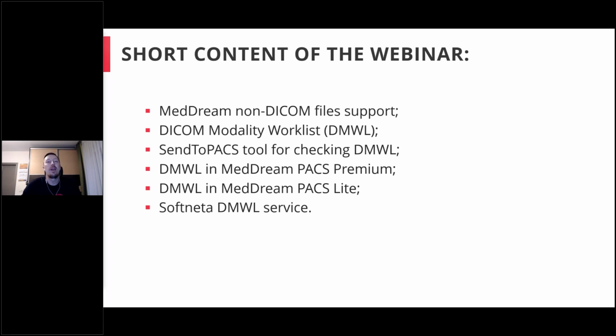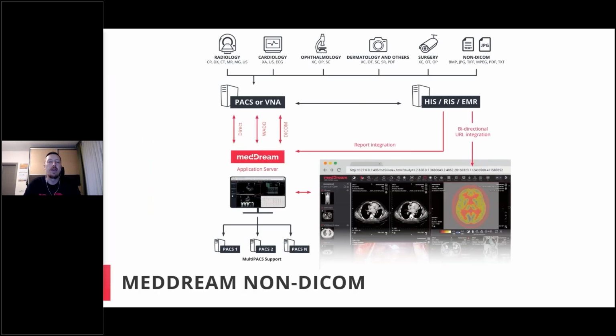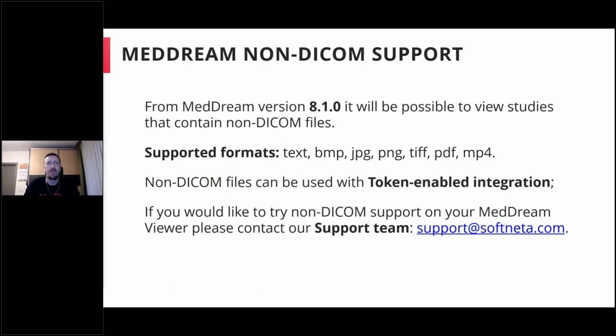And of course, I will talk about the MedDream PACS Premium and MedDream PACS Lite, how we can create the worklist in these two systems, and I will present you our DICOM Modality worklist service. So let's jump first to the first part of the webinar about the non-DICOM.